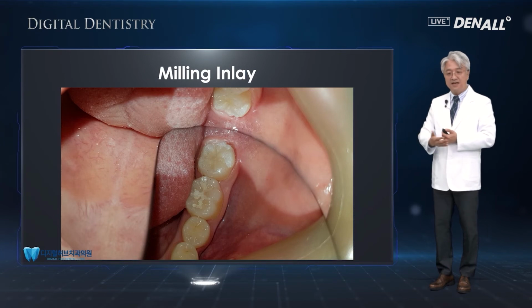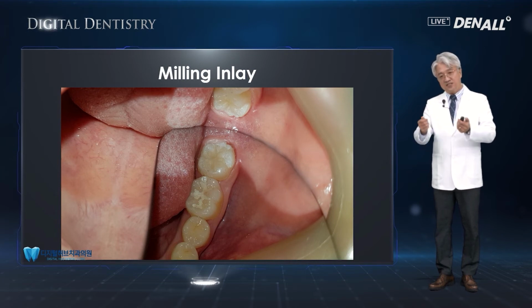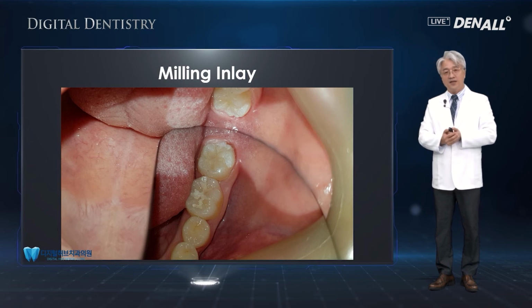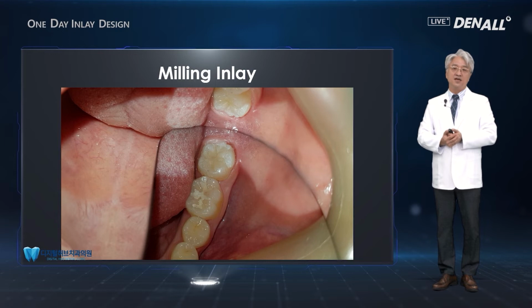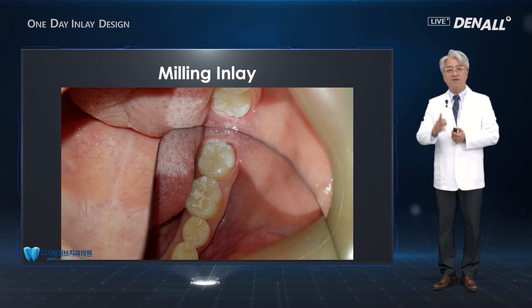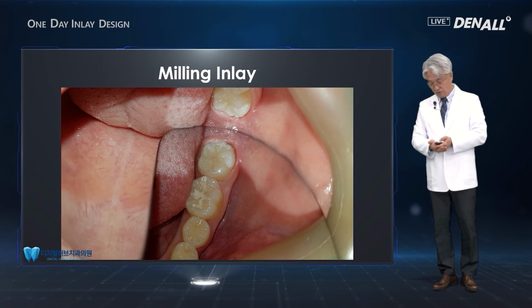And the bonding material is resin cement, so it's very good for bonding. And even if it's not the best fit, or if there's a dead space, it can be covered with the resin cement. And clinically, the CAD/CAM inlay advantage is that it can give you much better results.